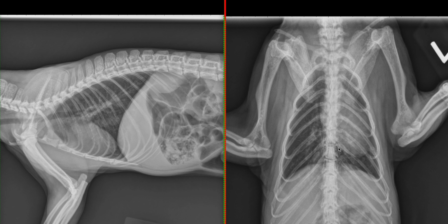The cardiac silhouette is shifted leftward. The pulmonary vessels and pulmonary parenchyma are normal. We do observe smooth remodeling along several ribs, and this likely reflects healed rib fractures.